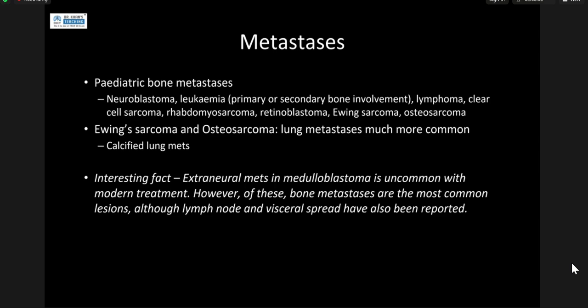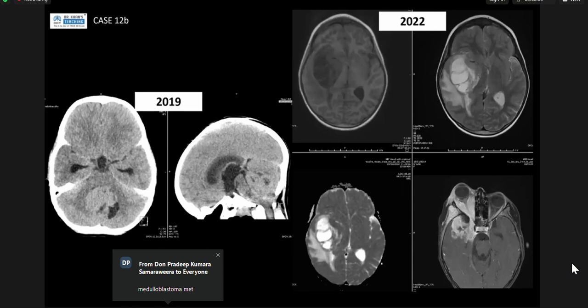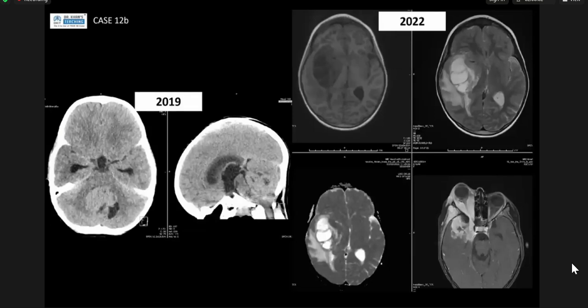And actually, for that, was that a medulloblastoma? Sam? Yeah, there was a medulloblastoma, and if you go back to the one slide before, posterior fossa tumors in kids. I know this can be a bit different in adults, but we are doing a pediatric talk. So posterior fossa tumors, it's hyperdense. In the fourth ventricle, the first thing you think of is medulloblastoma. Yes, you can think of other things like hemangioblastoma, but often this is a non-contrast scan. You're thinking there'll be contrast enhancement with a bigger cystic component. The other thing you think of is a pilocytic astrocytoma. Again, a much larger cystic component.